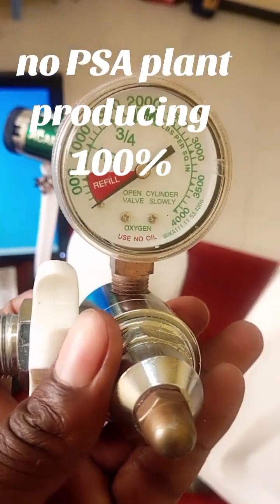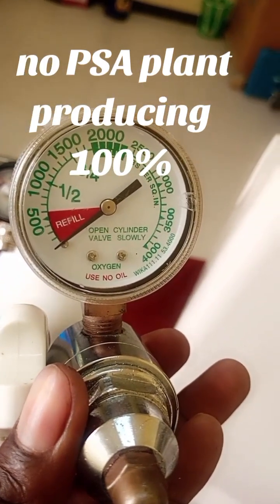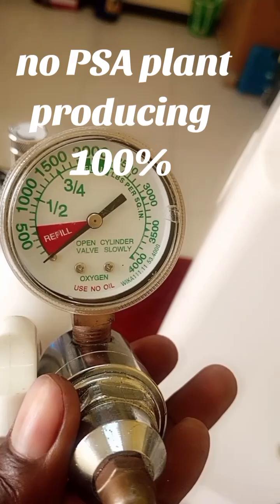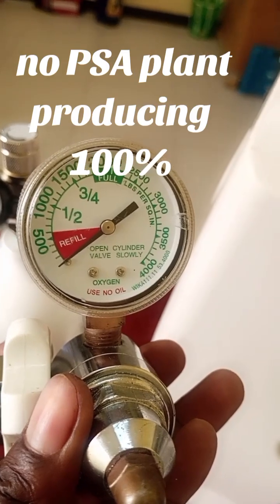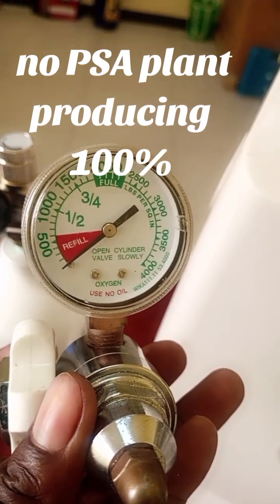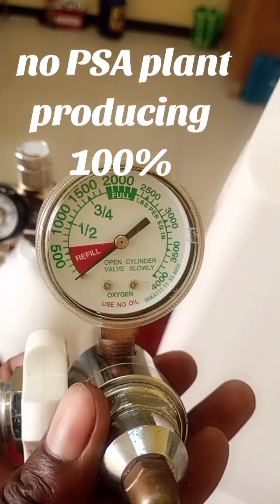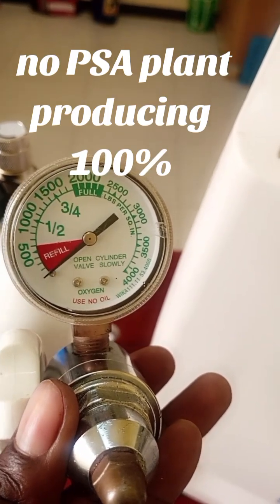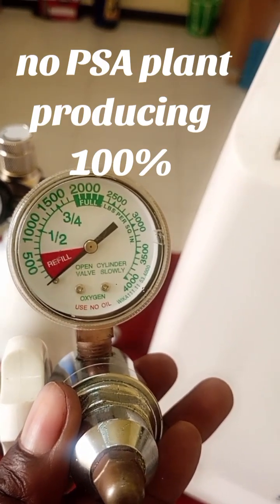As you can see, the arrow is now at the refill indicator, which is in red color, and the green part means it is full. Once that arrow moves directly to the full point, it means your oxygen gas cylinder is full, and it is advisable that when refilling this oxygen gas cylinder, you don't refill beyond that full point.